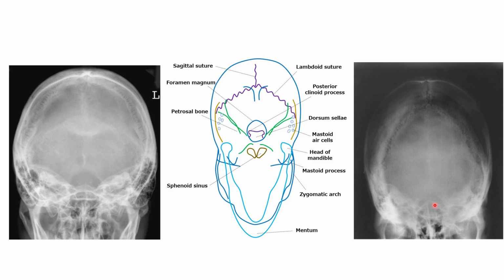image. Now I've already determined that this is a good image because I can find the lambdoidal suture, I can find that occipital bone, and that's really what we're looking for. We're not looking for dorsum sella on this x-ray. It's not a dorsum sella x-ray. It's a Towne's x-ray for the occipital bone. So, if you can find that lambdoidal suture and identify the occipital bone within that lambdoidal suture and know that these are the parietals out here, then you should be able to identify both of these images as diagnostic AP axial Towne images.